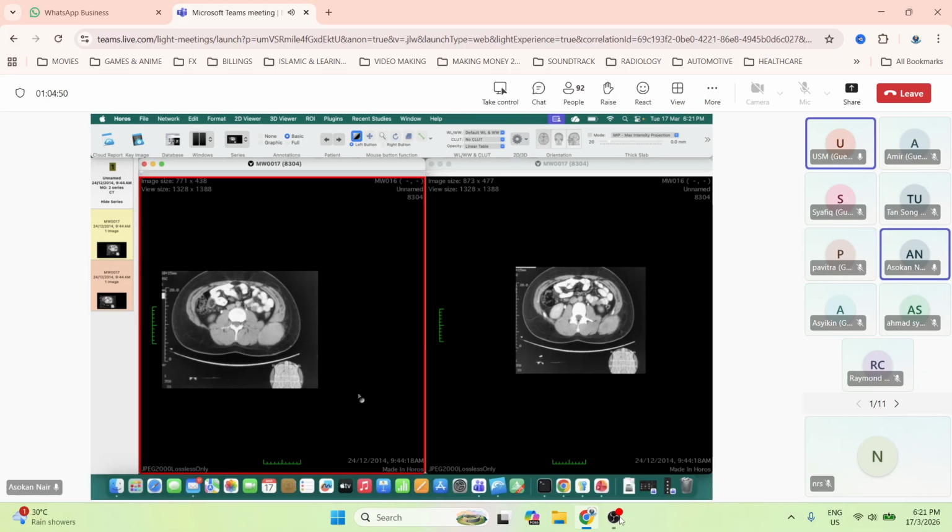Okay? Gardner syndrome is where you get a familial polyposis, and what mass is this? Is it a rhabdosarcoma? Is it a liposarcoma or what? What's the name of this tumor? No idea. It's a desmoid. Yes, the desmoid tumor. Okay. So this turned out to be a desmoid tumor, but that's a differential diagnosis in this case.